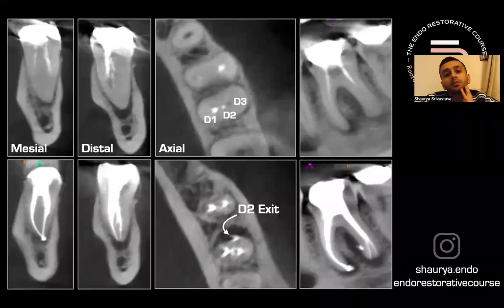Okay. So this is, I took a post-op scan again. I consented the patient because I wanted to take a post-op scan to understand anatomy and for educational purposes as well. Because we're running a CBCT course, Burzine and I, in Feb. We'll talk about that a little bit later.